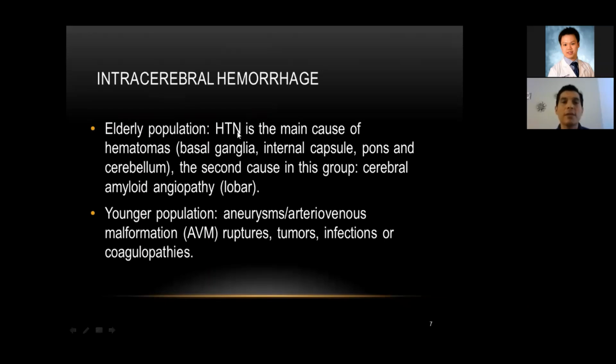In case of intracerebral hemorrhage, if we see blood in the CT scan, and you know the time of onset of symptoms, you can apply this knowledge, these causes that you know. But you have to remember too that not always all patients will present as clear as these.